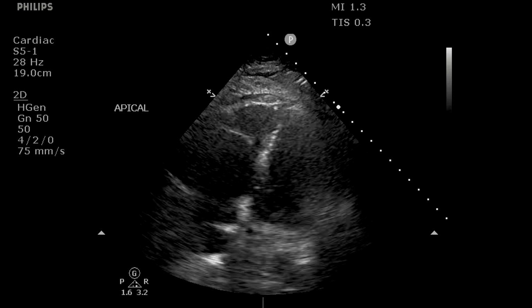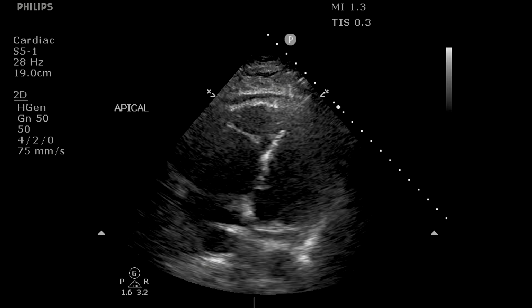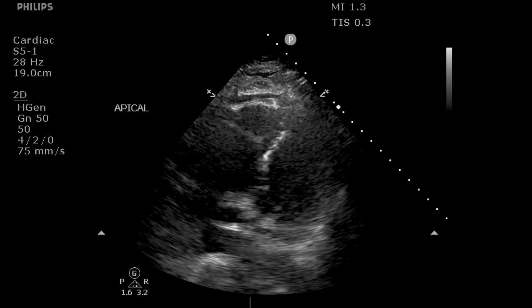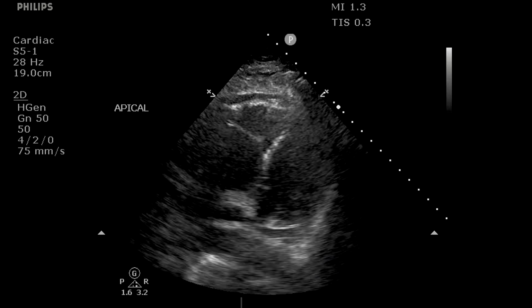The heart is trying to respond by ramping up its speed to be able to get as much blood to the tissues to perfuse, but there's no blood to perfuse, and so the LV is just empty, right? We'll see a similar example later. But you may see that hyperdynamic compared with something like this, where it's probably a little bit reduced, even though the rate is increased, is what I'm trying to get at here.